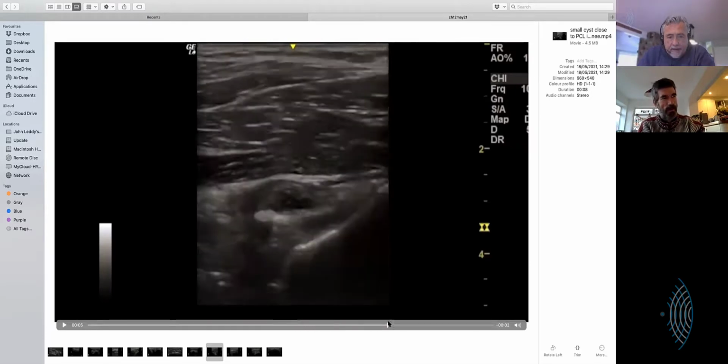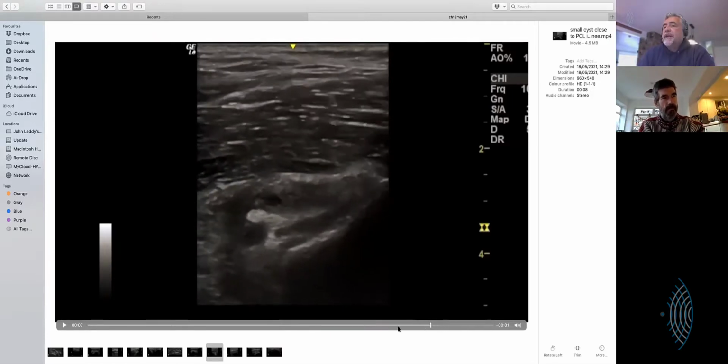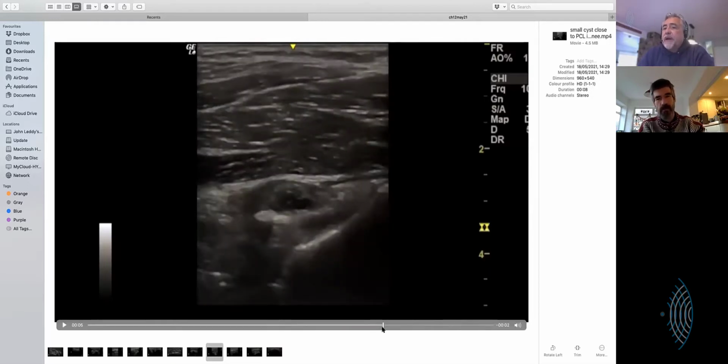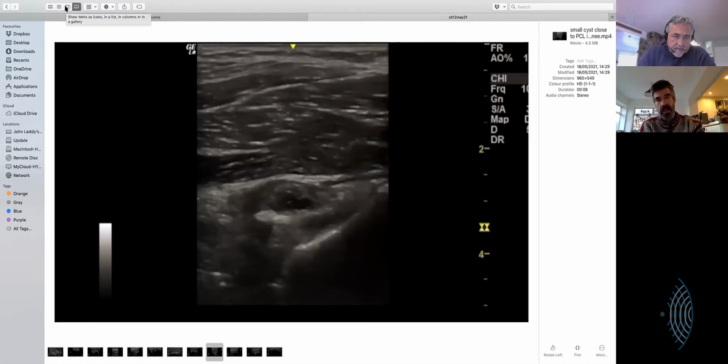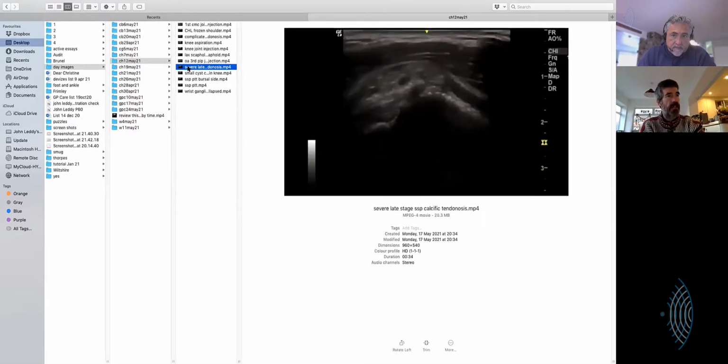Yeah, well, it would be nice to be able to see it, because I would imagine that if there was an acute injury, we would certainly expect complex fluid, or some level of effusion. But this looks like it's more of a reactive cyst. You were saying, yes? This is long-standing, and there's a cyst that wraps around it, which may relate to a previous injury, but you're just guessing. It was actually reported on the MR, and I went looking for it specifically just because it's there.